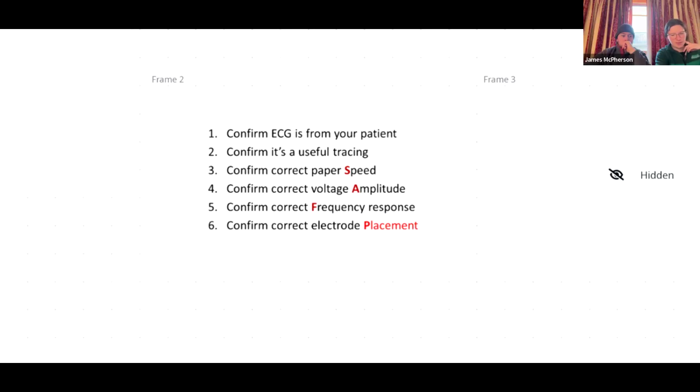Is that the rectangle thing at the start? Absolutely, yeah. The rectangle thing. Like a centimeter tall then? Maybe, at a guess? I guess it will be a centimeter tall, but I guess it depends on the size of your ECG paper. But it is, yeah, it is a centimeter tall. So if it's calibrated sort of accurately, then it will be a centimeter tall.